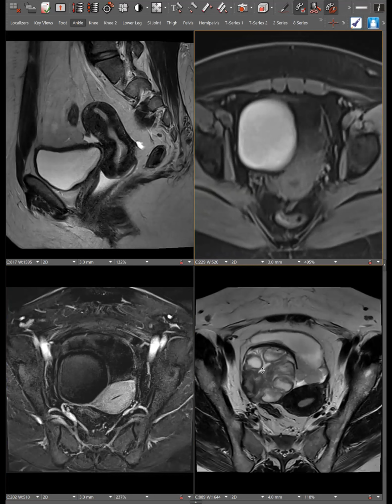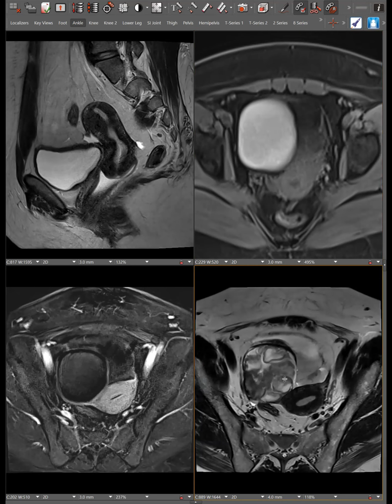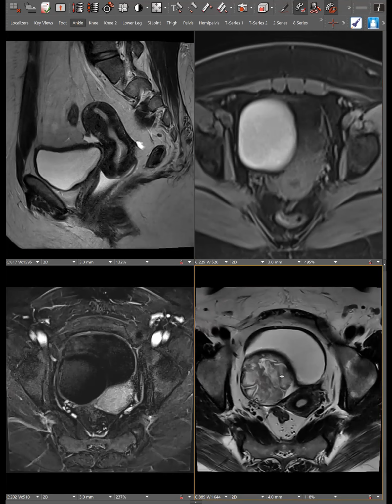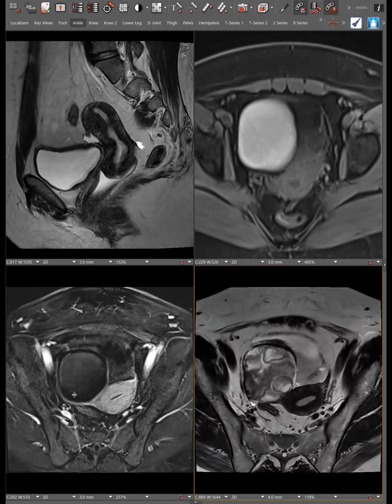Yeah. So that's the catch of this case. This patient had hormonal stimulation because she was trying to get pregnant with IVF, and these are all enlarged follicles in the right ovary, and they're very dysmorphic looking. They're not nice robust looking follicles, even with hyperstimulation. And the catch that makes it a case of ovarian torsion is that these follicles do not enhance. Follicles should have nice enhancement on post-contrast images because they have blood flow to them. So all of these are dead.